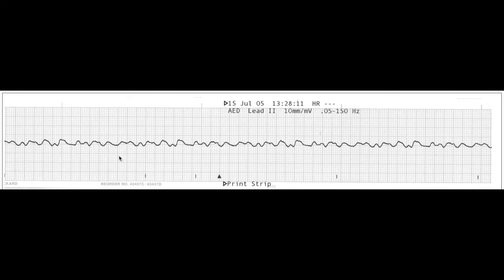Now an example of ventricular fibrillation. We can see this straight away because we can tell that our rhythm is completely irregular, and it's so chaotic, we don't know what's going on here. There's no way of interpreting the rate because we don't have any definitive waves at all, no P waves, no PR interval, no QRS complexes, nothing. So this is actually VF, and we say this is fine VF because the amplitude is quite low. If it was larger, it would be coarse VF.